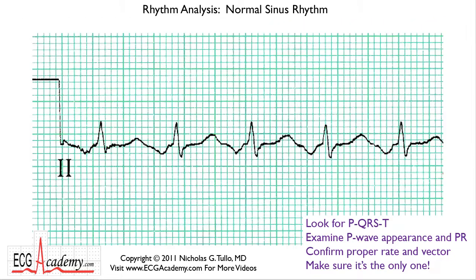Okay, so let's get some more practice here. Now here's a patient. The first thing you see is it looks a little bit funny. Of course, the biggest signal here is the QRS complex. So we can label the QRS here, and we see that it looks pretty regular. But what's the rate? This QRS lands near a heavy line, so let's count backwards.